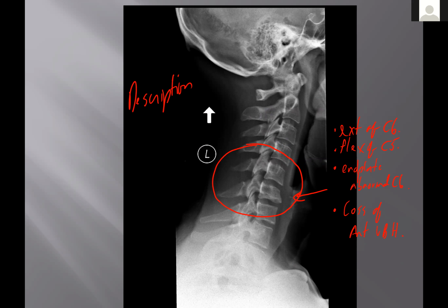Mild osteopenia. Yeah, there might be osteopenia here. I think a lot of this is related to the technical factors. They're pretty young, mid-40s, so I'm going to pass that. What else? Facet arthrosis. Facet arthrosis, okay. What else?